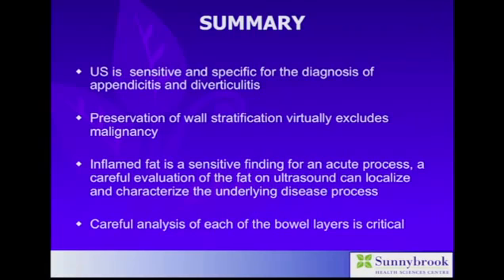So in summary, ultrasound is sensitive and specific for the diagnosis of appendicitis and diverticulitis. Preservation of bowel wall layers virtually excludes a diagnosis of malignancy. Inflamed fat is a very useful sign on ultrasound, and we must look for it specifically. It allows us to localize the problem and find the underlying disease process. And I hope that I've demonstrated that a careful analysis of the bowel wall layers can be extremely useful in arriving at a specific diagnosis.